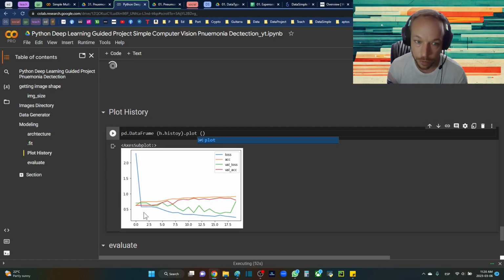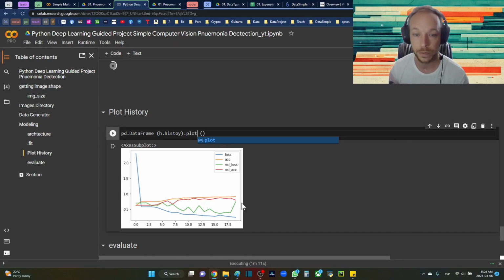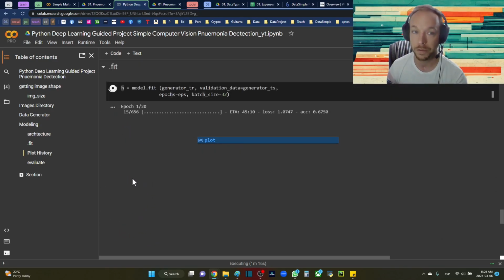We can see we drop really easily to the train. Because this jumps around a lot, this is actually because of the data augmentation. This is kind of a good thing because it's making sure that we're not getting stuck to one image being in a certain place or one certain direction, certain rotation, where we're augmenting the images to hopefully build a more robust model. Okay, so really you could train this for quite a lot longer. I just did it for a little bit to show.